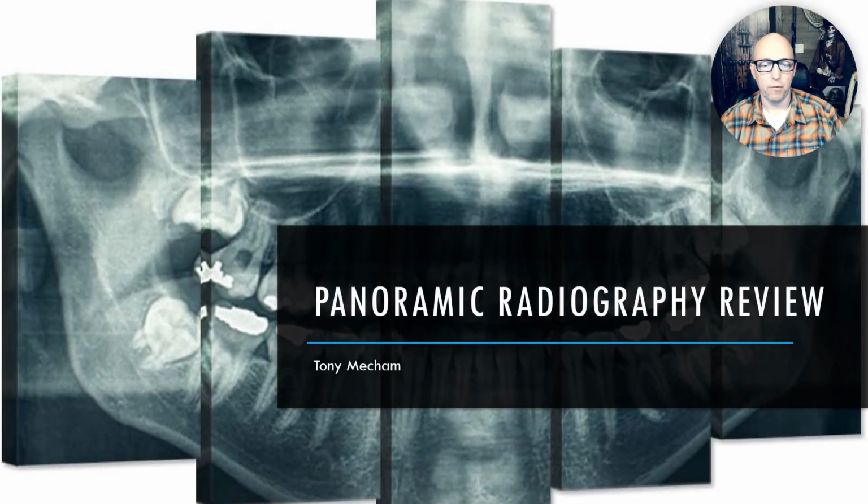Welcome back. Now we have a panoramic radiography review. And again, this isn't meant for first year dental students. This course is meant for second years and just a review of things that you've already learned. So I go very quickly over panoramic geometry. I go into panoramic anatomy fairly quickly, and then just a review of positioning and quality errors.